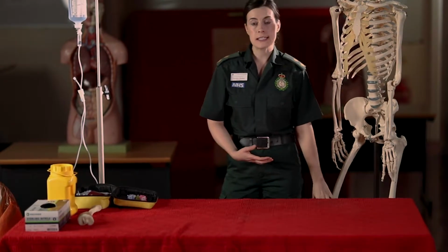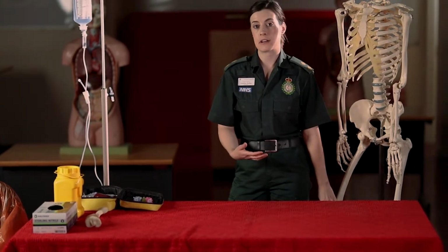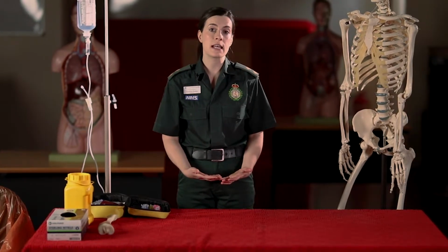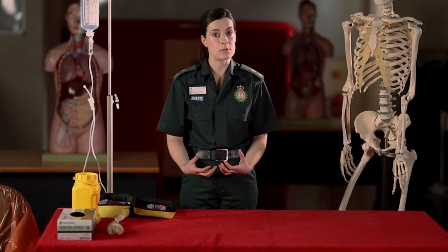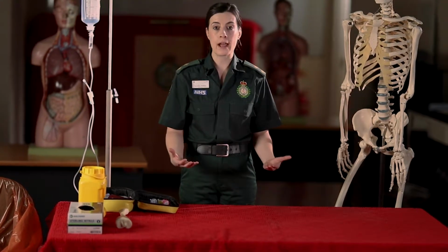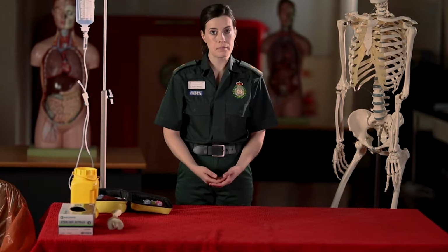The proximal tibia is the site that we should be using in paediatric patients. We are able to use different sites in paediatric patients. However, because of the difficulty in locating the landmarks on peds, it is a preference to use the proximal tibia site. And if you go away from this, it's important that you document why.